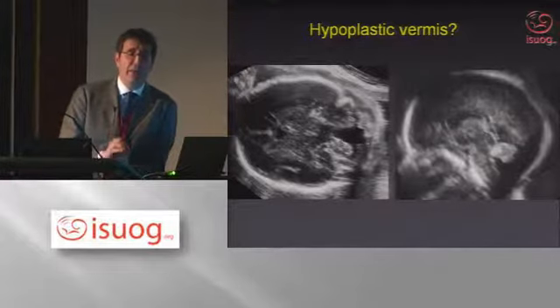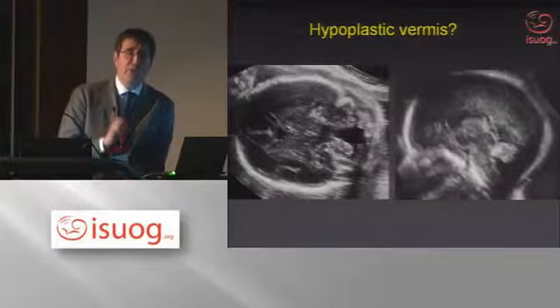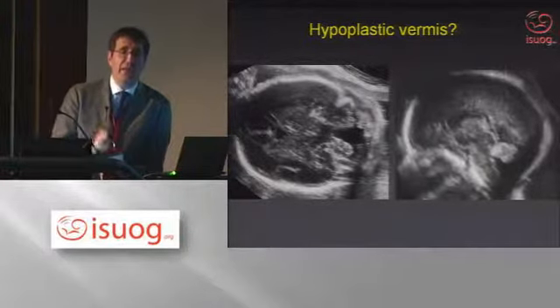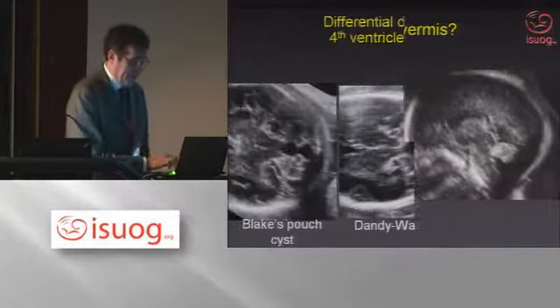You may debate a lot about the anatomic appearance of these, but remember, there is a strong association between any of these and chromosomal aberration. So a detailed evaluation of the entire fetus and the karyotype are very important. We'll go back to this case in a moment.